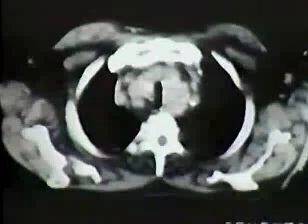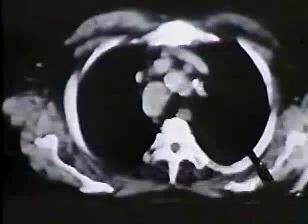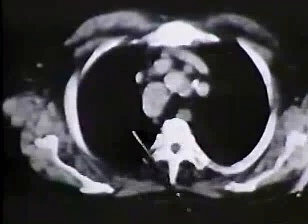Now, this can also be a little bit confusing if you look a little bit lower, where we see that one lobe of the thyroid has extended even farther down than on the other side. The trachea over here is still displaced. Here's a little more of this enlarged thyroid, and if we work hard, we can see the subclavian artery, the carotid artery, the brachiocephalic artery, the left subclavian vein, and some dense contrast in the right subclavian vein.